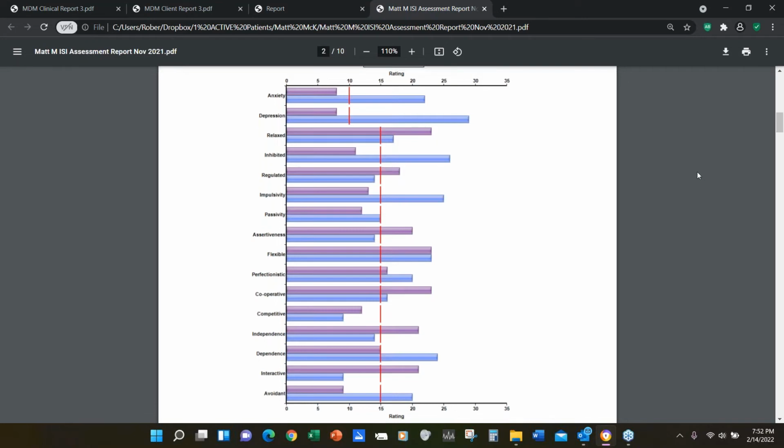And I see that you're saying your anxiety is like 30, and look at the map, there's this imbalance in your asymmetry. I don't explain all that asymmetry. It's just too much for most people coming in, because they feel overwhelmed by what they're struggling with in the first place. So when I tie it to the symptoms, I'll cherry pick which part of this whole collection of information we have available, and I'll point it out, and then they go, wow, there's something we can do. People really feel that, because it's a sales pitch too, because you want people to buy into the idea that they could get this help, and you can show them on paper that there's something here for them.